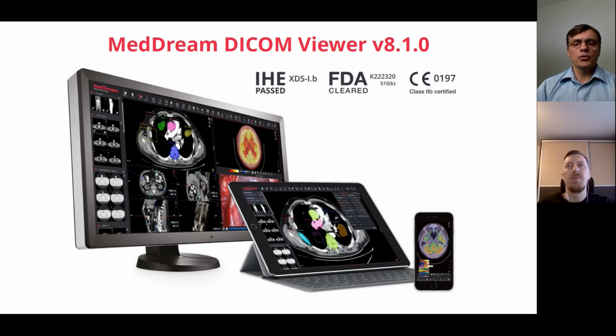So coming to today's topic, I hope everyone can see my screen. I'm very proud to announce that version 8.1 is already available on our website. You can download it, update your systems, and test it. This is really a brilliant version, and later on we will go through all the functions.